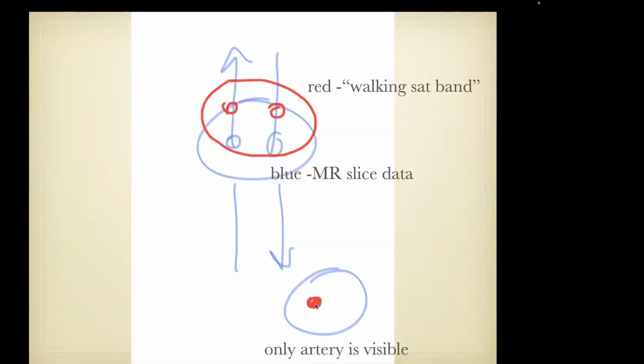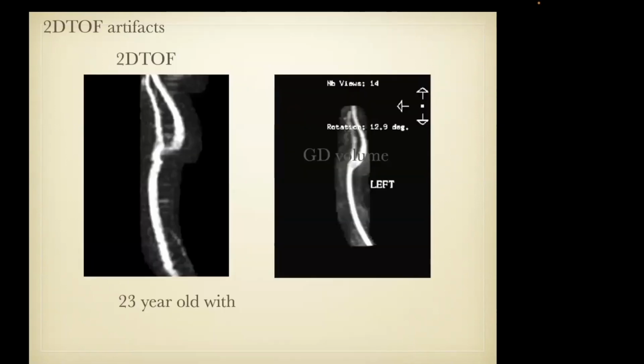And then, of course, when we look at an MR in the neck, like for example here, you'll notice it has this jagged appearance. Some people call this a stacked coin appearance, because with a little bit of patient motion, we have a little misregistration of the edge, and it gives us this jagged edge.